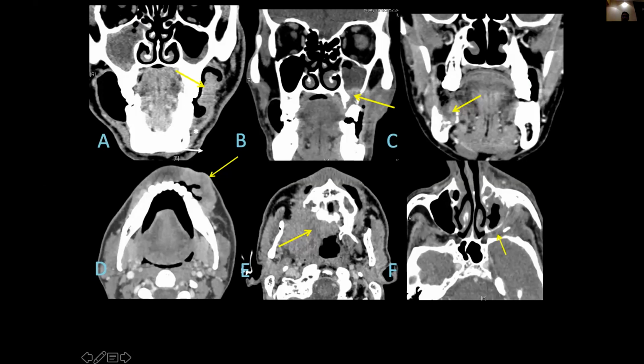Again, this is an example of the upper maxillary involvement. The bone is completely eroded, the infratemporal fossa is involved, and the disease is extending into the lateral wall of the pterygopalatine fossa, that is the pterygomaxillary fissure, and reaching up to the pterygopalatine fossa proper. So this is unresectable disease. This particular disease must be confirmed that the disease is not extending into the foramen ovale or cavernous sinuses.